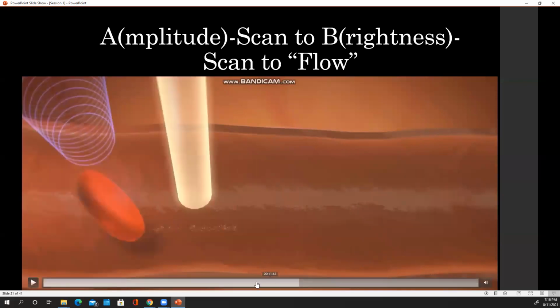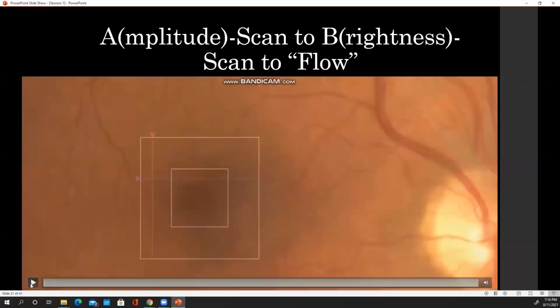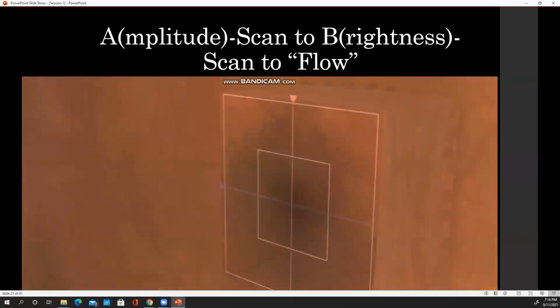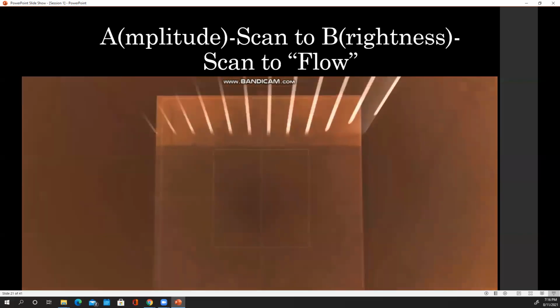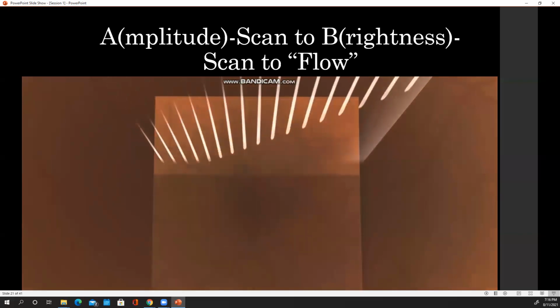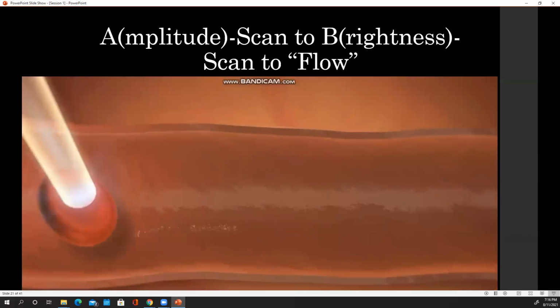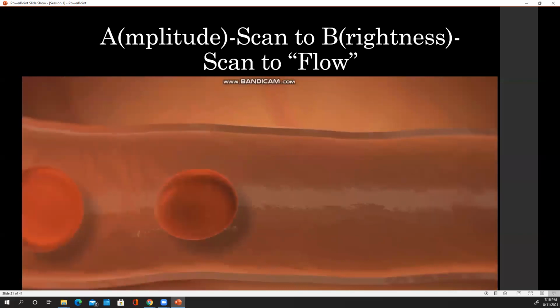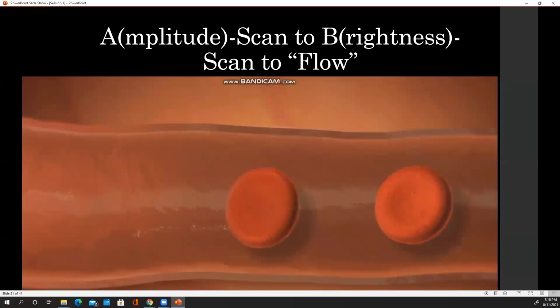Okay, let me move it back, all the way back here. Actually, let's start from the beginning because it's easy now that you get it. So first B scan, second, third, fourth. Okay, there's 4 in this one. Now we're going to zoom in and see what's going on. That's the first B scan. These are each individual A scan lines. Here's the second B scan. Here's the third B scan. And here comes the fourth B scan. And in our case, we do a fifth.